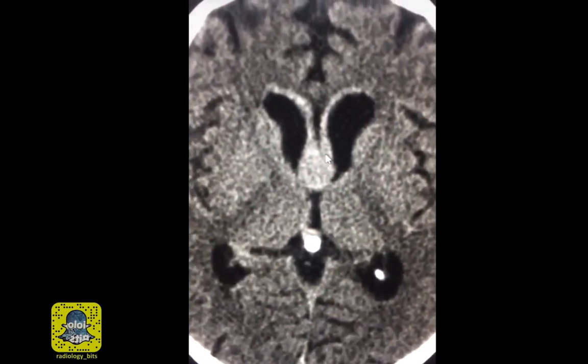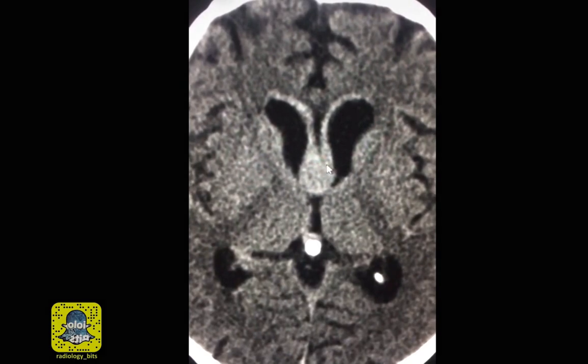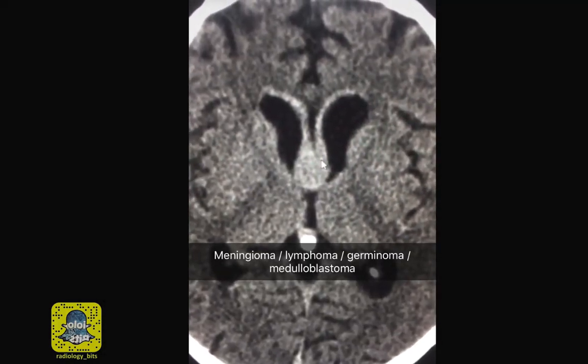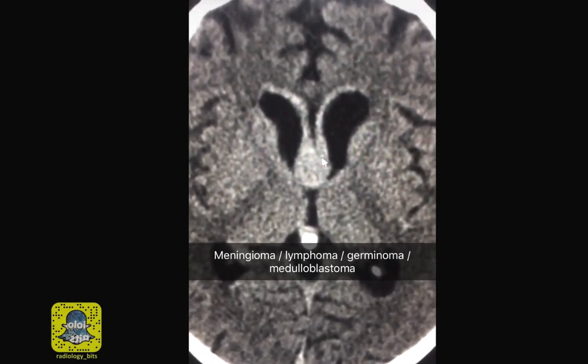So tumors or neoplasms with condensed cells would give you a high density without IV contrast. And the classic tumors that are bright without contrast would be meningioma, lymphoma, germinoma, and medulloblastoma.